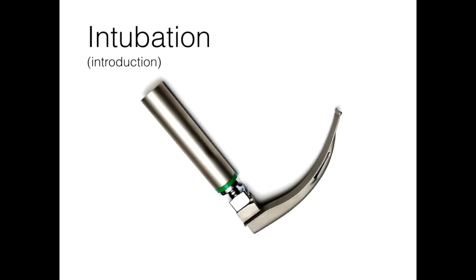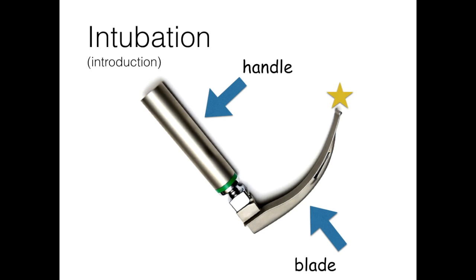The vast majority of tracheal intubations involve the use of a viewing instrument of one type or another. Since its introduction in 1895, the laryngoscope has been the most popular device used for this purpose. Nowadays, the laryngoscope consists of a handle containing batteries to energize a light source at the end of the blade to allow visualization of the larynx.